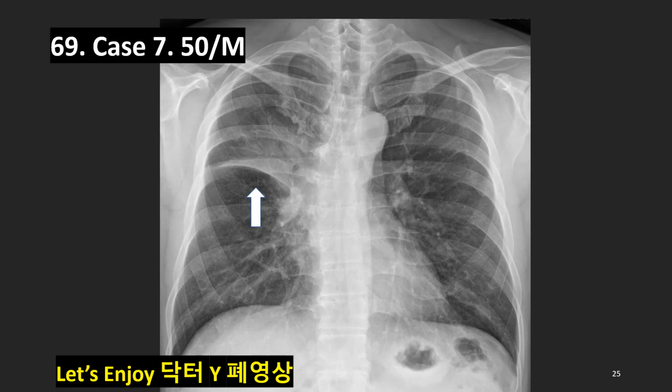Now we are almost there. This is the last case of our tour. But this frontal radiograph shows us something different from the previous 6 cases. Not mediastinal widening, not mediastinal mass, not hilar mass, but right upper lobe consolidation and air bronchogram, something like alveolar lobar pneumonia. What's this?